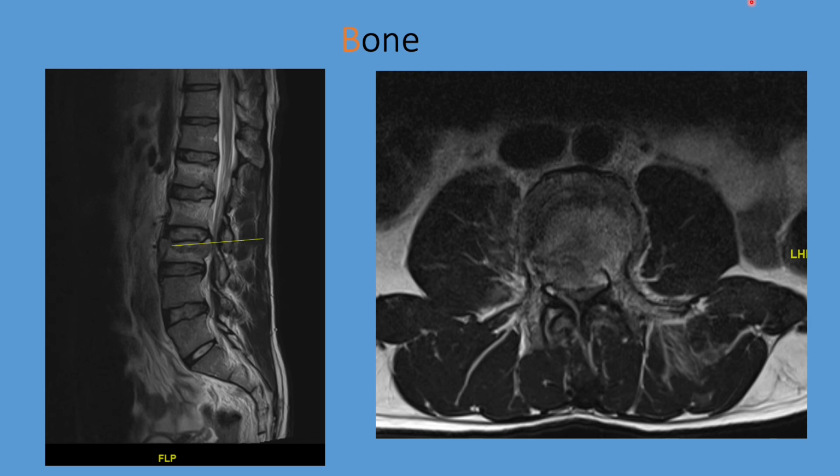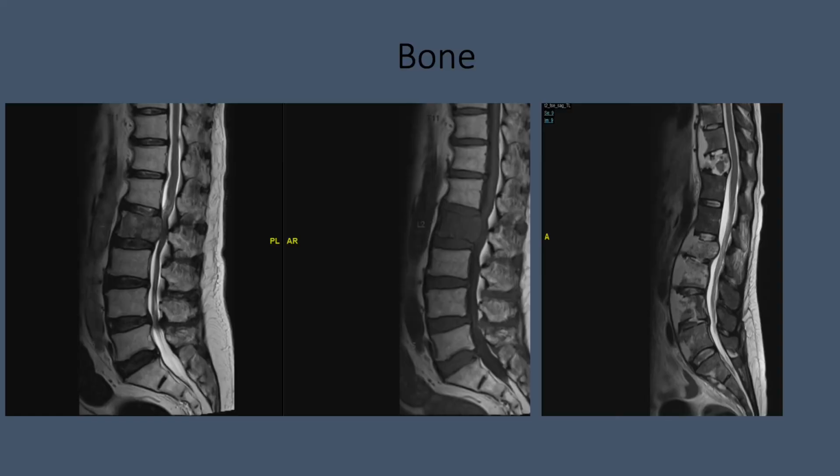I told you before, it's not just fractures. Signal changes in the bone can indicate something more sinister. For example, here, you can see there is a fracture in the lumbar 2 vertebra here. And you can see the signal is quite different from the other corresponding vertebrae above and below. And it is causing a canal compromise. And this image, which is a T1 image, actually shows you also a signal change, which possibly means there could be a pathological fracture of this particular vertebra. And here you can see the typical signal changes that you can see in multiple levels of bones.